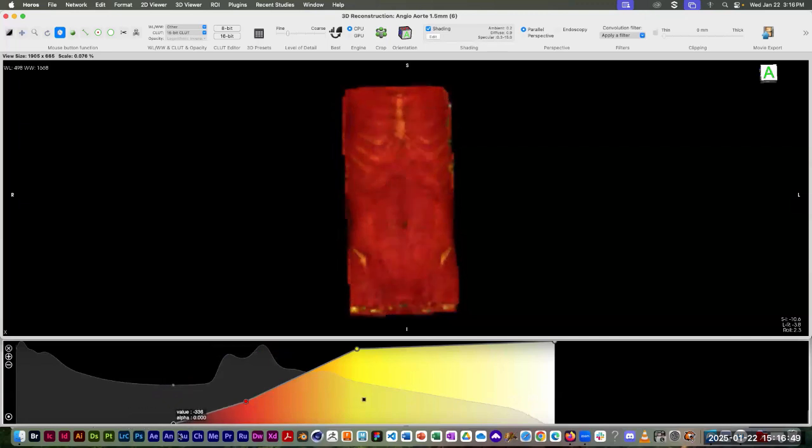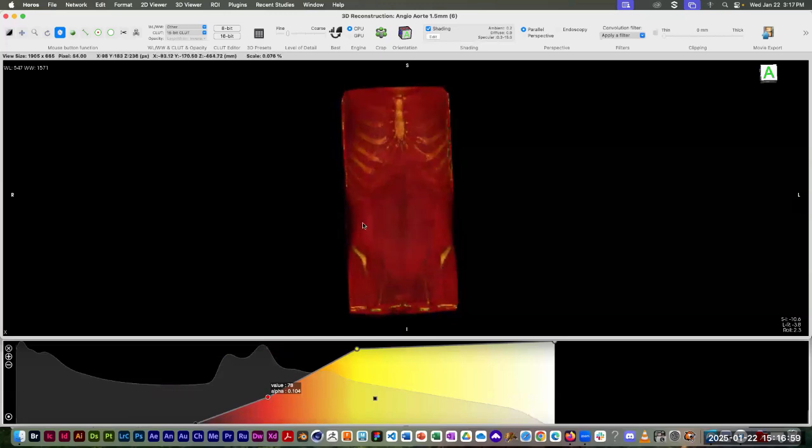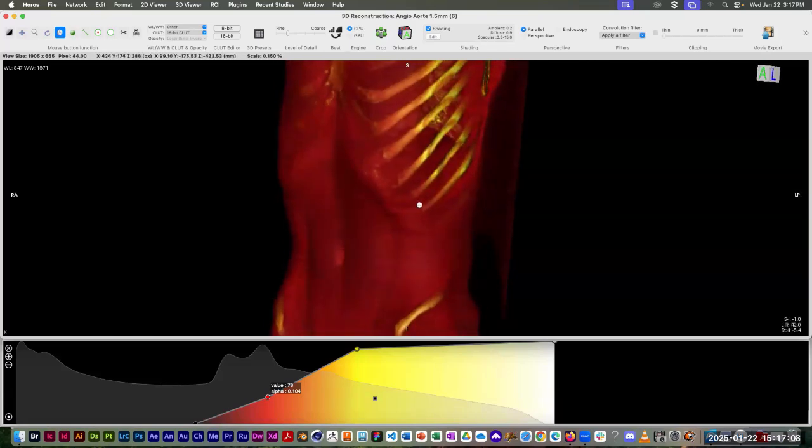The skin goes away. Depending on exactly where I position this red dot, I can start to see things like abdominal muscles, like there's the rectus abdominis again, and the external obliques over here on the sides.